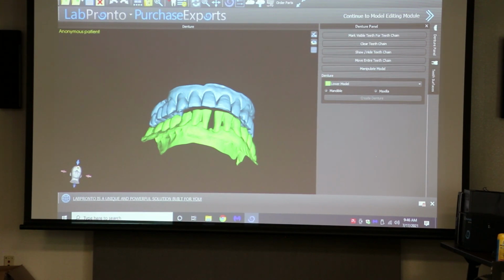So right, and I'll tell you guys, if you guys are doing this at work, I would invest in monitors like what you have in front of you. If you guys are working off of little 19-inch resolution monitors and you want to have all these panels open and various things, you need a workspace. So we bought nice big monitors at work. Invest in them, they're cheap. Get something at least like this, like a 27-inch, where you can have more stuff open.